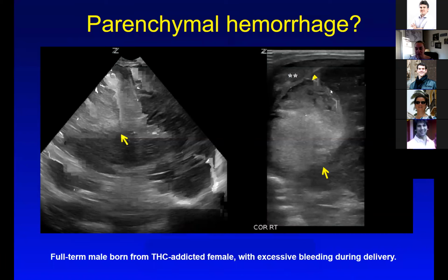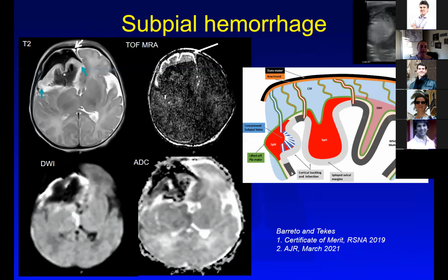You do see a large area of focal hyperechogenicity, which looks like hemorrhage. You almost see a cortical boundary but I wasn't sure what I was seeing over here on this head ultrasound. And looks like there is an extraaxial hemorrhage over here. Off of the head ultrasound, we weren't sure if this was subdural or not. Nonetheless, as soon as the baby became stable, we did an MRI.